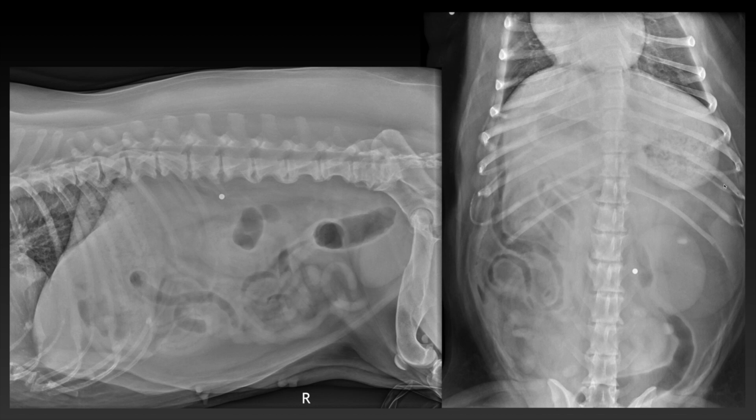The kidneys have a normal size and shape. I can see the left kidney here, and the right kidney here. And the urinary bladder is mildly filled. The stomach is moderately filled with granular material and gas. I see granular material here. And in the VD view, there's granular material in the fundus and gas in the region of the antrum. The gastric axis is normal, it's more or less parallel to the ribs.